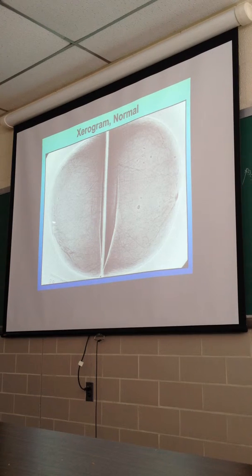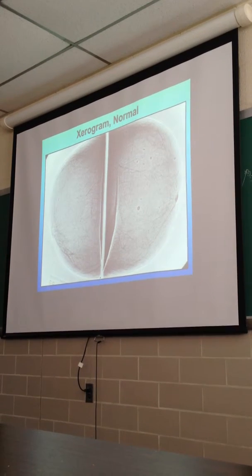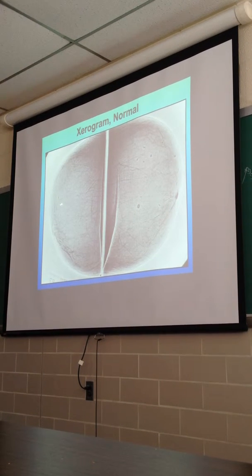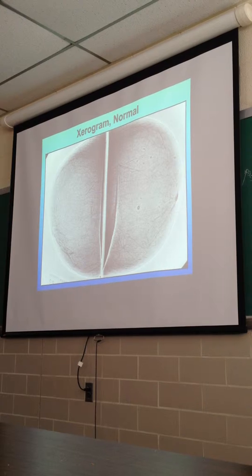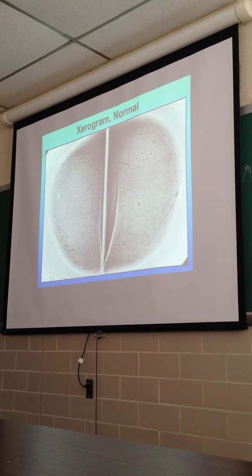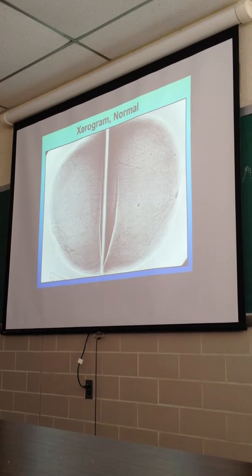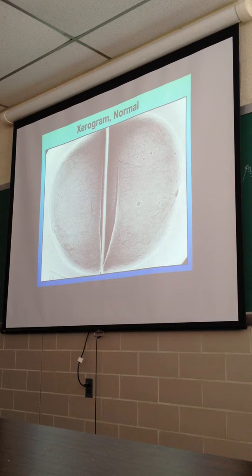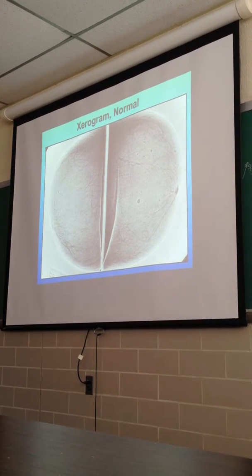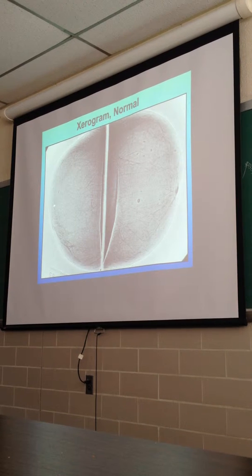These are all ducts. There's like darker, these? Take the pointer, yeah, right there. That thing? I don't know what that is. You're probably right. These little things mean nothing to me. Okay.